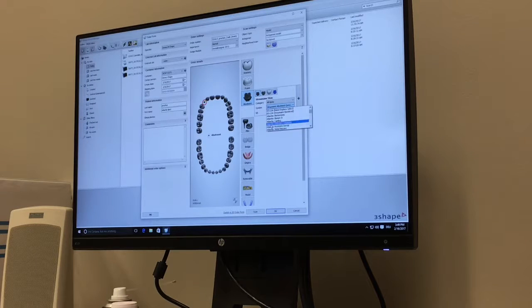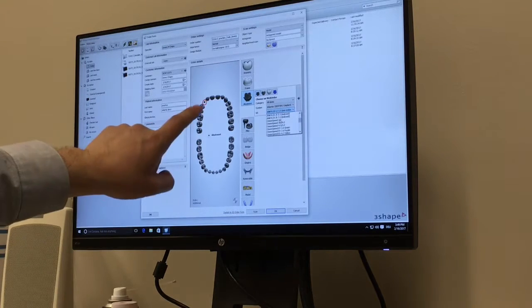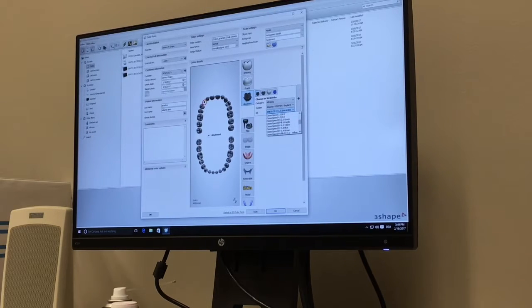There it is. The platform that we're doing is the 4.2 EV from Astra and the 5.4. I think that was the 5.4. So that's apply implants. We're going to pick the platform. In this case, that particular one is the 4.2 OsseoSpeed EV, which is the yellow one. Okay, and then we're gonna do the next one.